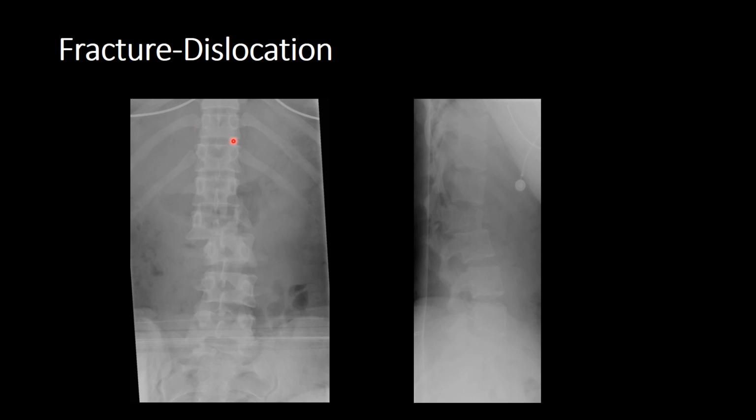If we come down the vertebral bodies, we can see that the proximal vertebrae are completely in alignment. Spinous processes run down the midline. When we get to L2, we can now see that there's lateral translation. There's a large fracture fragment, and we can't see our pedicle on the left, indicating there's been disruption to the posterior column. If you look at the distal portion, there's been rotation of the vertebral bodies, which we can tell by the orientation of the spinous processes in relation to the proximal portion. Just quickly go around the rest of that.